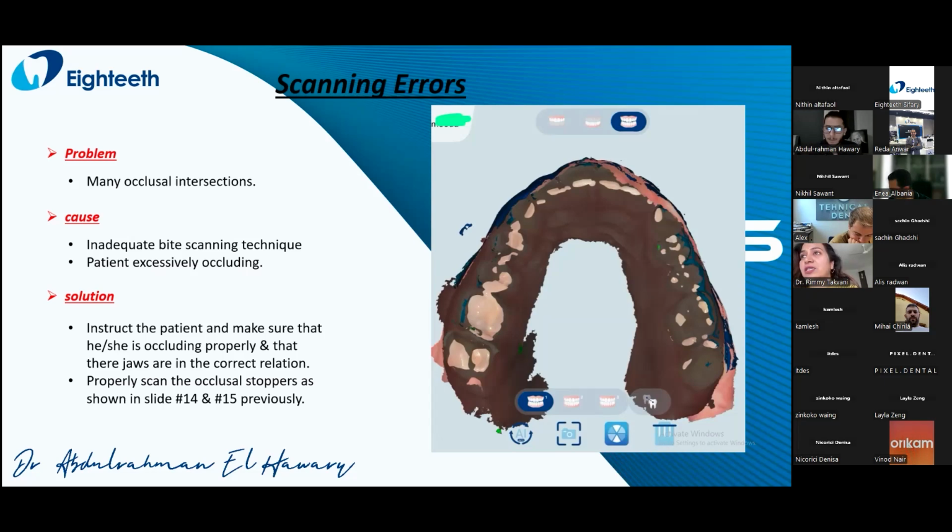One thing which I have liked in this software, which is missing in a lot of other software, is that you can edit even after you have rendered the whole project. But in the previous software, after you have finished the whole case and already uploaded it, sometimes the lab gives us the work back saying that you do not have enough clearance.